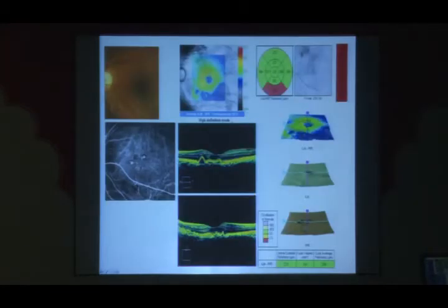Now again, a sharp pigment epithelial detachment with a small bumpy pigment epithelium and a little bit of subretinal fluid. But what you see is multiple polyps and a large BVN here. But this section actually did not go through this polyp. It actually went through one side.